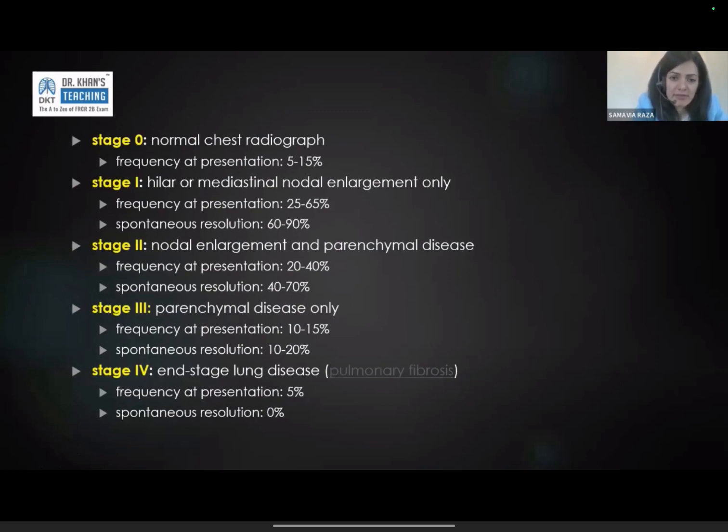You don't really see calcification in the acute presentation. It takes time to develop. The enlargement comes first, and the healing and chronic stage sees the lymph node calcification. If you have calcified lymph nodes and they're slightly enlarged, you're more reassured that it's a benign pathology. But when you have non-calcified lymph nodes that are large and rounded with the loss of the fatty hilum, you really have to sample them.